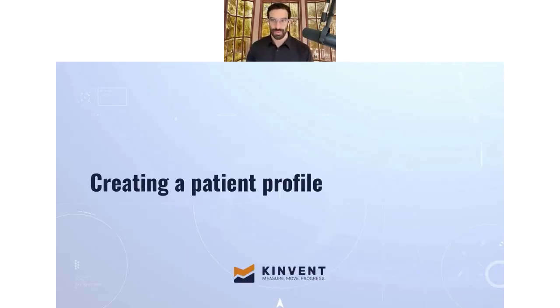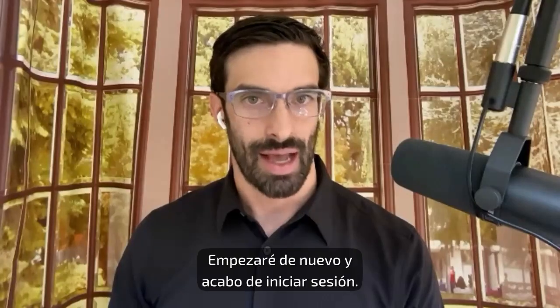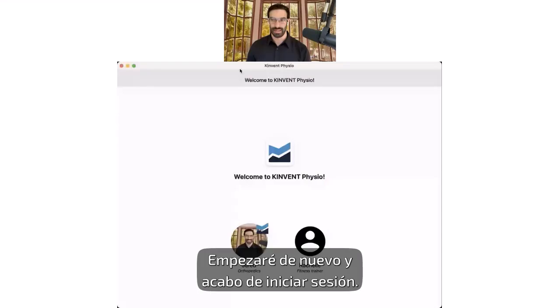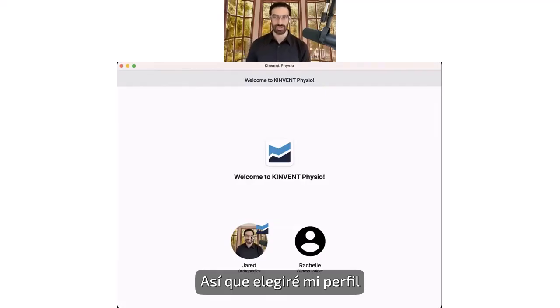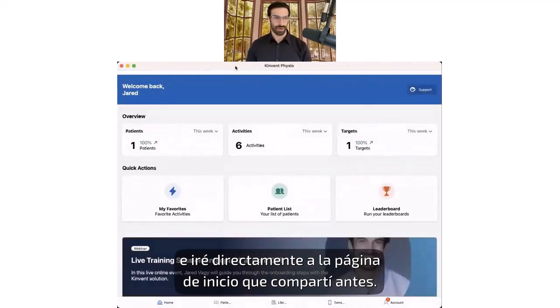So creating a patient profile, you could see here, I'm going to share the app one more time. I've started fresh and I've now just logged in. You could see I have the 2 choices of the profiles that I set up. And so I'm going to go ahead and choose my profile. And I go directly to that home page that I shared earlier.